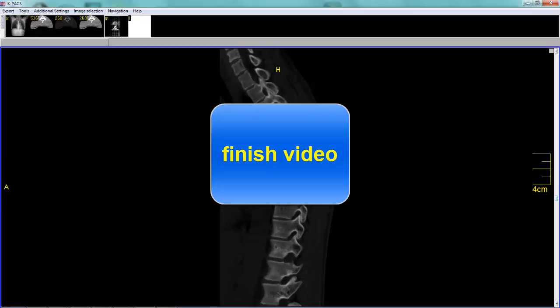the pedicles. So at the top here, here's the vertebral body, here's the lamina, the posterior elements, and here's a pedicle here, and here's a pedicle here, one more pedicle here, another pedicle here, and so forth. And they are all normal in this patient. Tumor likes to involve the vertebral bodies, but particularly likes to spread into the pedicles. So that is a key finding in tumor, is the fact that you'll see a bone lesion or destructive bone process that involves both the vertebral body and the pedicle.